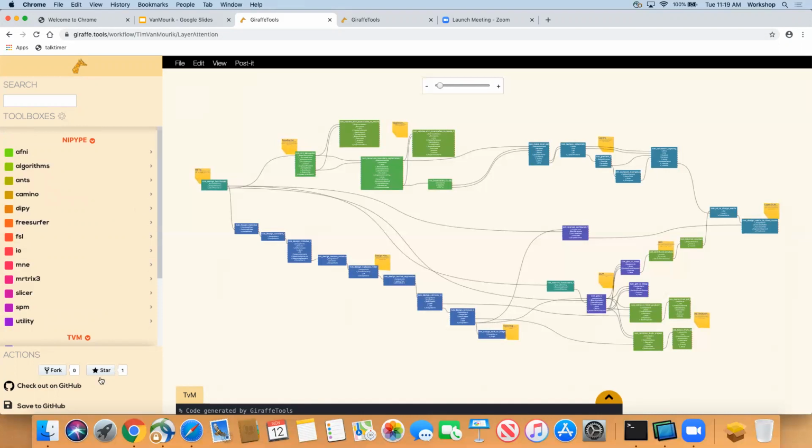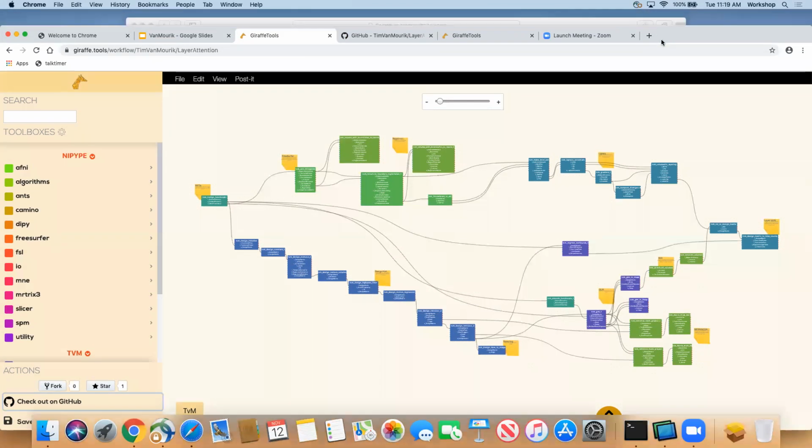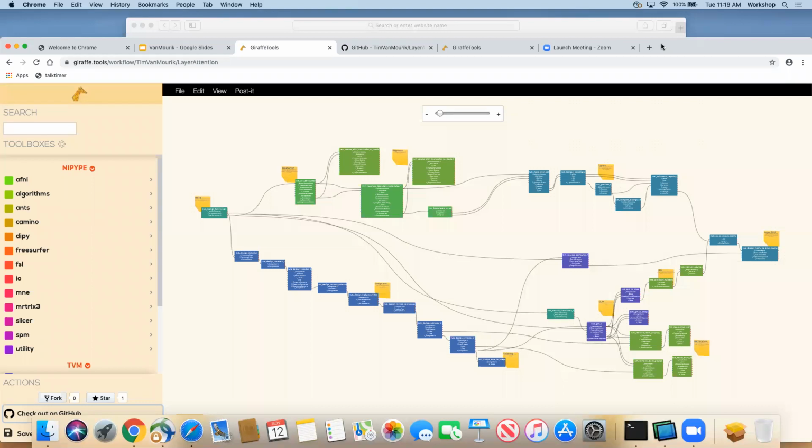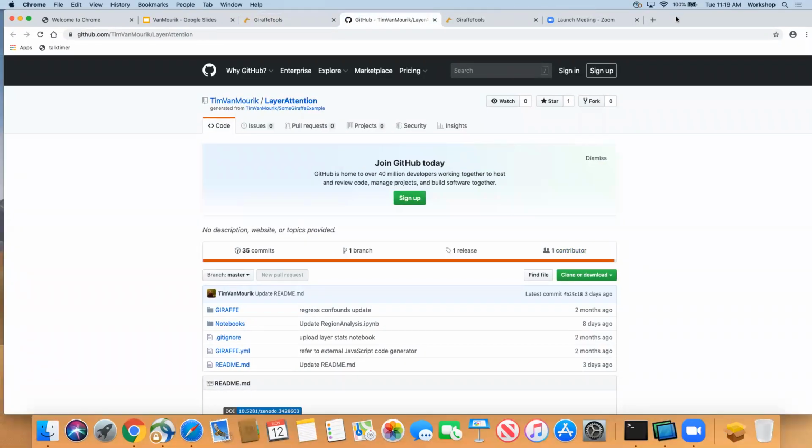But this entire workflow is also found on GitHub. So in the UI, there is just the... Oh, come on. Oh, no, I don't want to share. It's identical. They're aliases of each other. So this entire pipeline is saved here.